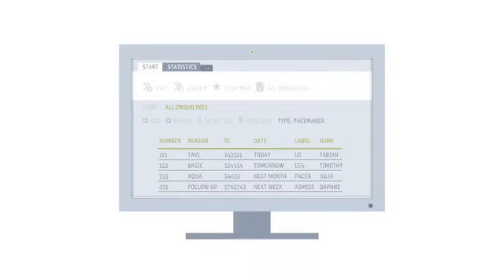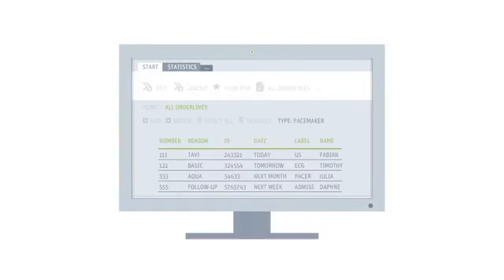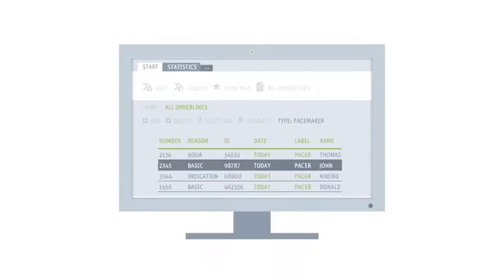In this case, the doctor opens the All Order Lines list by clicking on Start and then on the All Order Lines icon. Finding the patient will be easy. The patient may be selected with the help of a barcode or by entering the name. In addition, filters may be applied, for example, to select only scheduled follow-ups for one treatment room, or for appointments with a specific doctor. Select the patient, then select the order line with a double click.